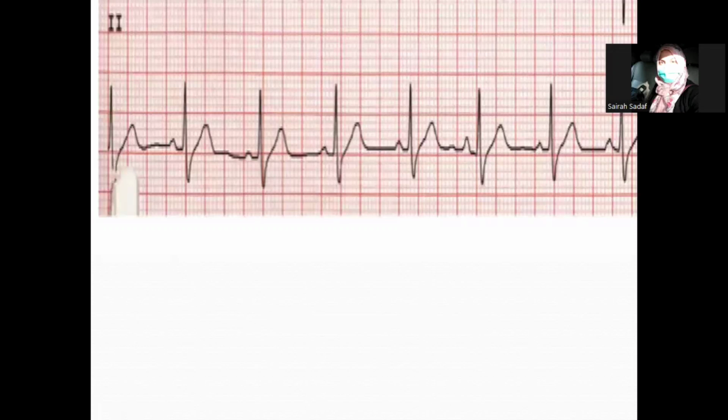Now calculate here. Now tell me here. 1, 2, 3, and 4. Divide it on 300 and tell me the answer. Quickly, everyone. Jennifer is saying 75. Khizr 75. Huma, Kashif 75. Shayan 75. Okay, good. So you know. Abdur Rauf is also saying 75. He's saying 76. Okay, 75 and Asma 75.